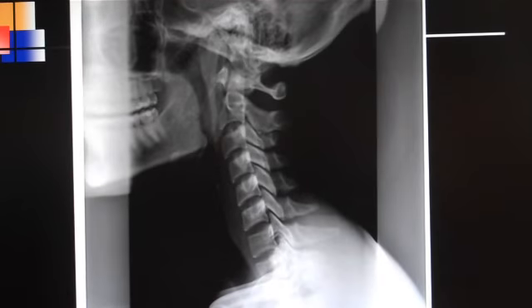Good afternoon. This is Dr. Bradshaw, and this is the first day of trying the flip video, and I am trying to present one view at a time to my students for RAD 1611. And so the first one that we're starting with today will be the lateral cervical view.